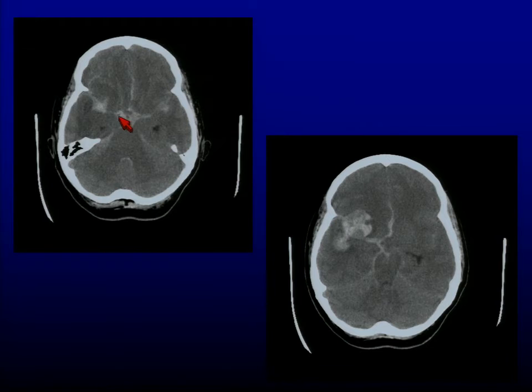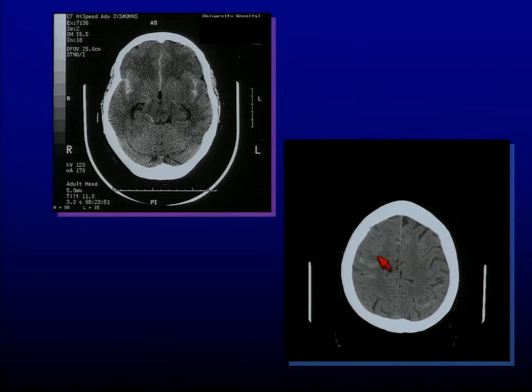Here's one. It did reflux into here, but you see nice. This poor person wound up having an MCA aneurysm out here, and so they first bled here, and it refluxed back into the suprasellar cistern. Here's another one that had an MCA aneurysm out here. They, again, reflux back to help you find it, but they can just bleed out here and not have to track the blood all the way back.